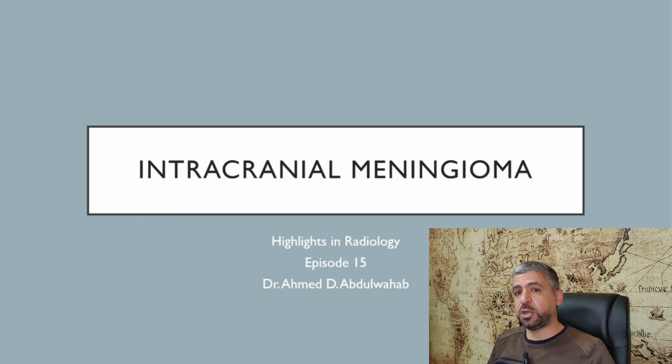Meningioma is an intracranial tumor that we see a lot during the daily practice of brain CT scans and MRIs. So there are multiple imaging details to meningioma that we need to know about. In this episode, we will talk about the meningioma, how it looks, what the types are, and all other details. Stay with me. Let's start.